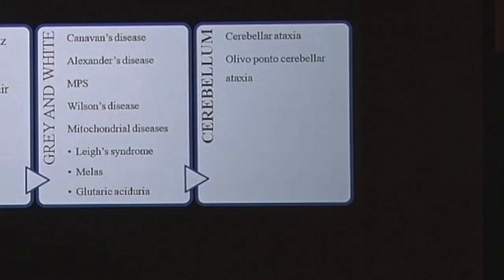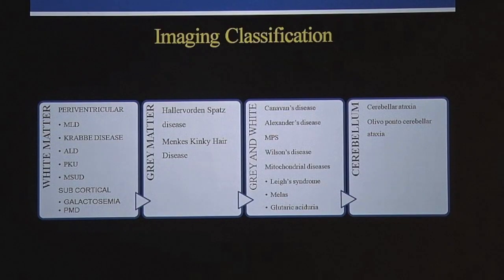it is diagnostic of Wilson's or hepatolenticular degeneration. And as I said, all these conditions so far that we looked at were symmetric. There are 4 or 5 conditions which are asymmetric, which will allow you to make the diagnosis of these conditions relatively easier compared to the conditions we saw so far.